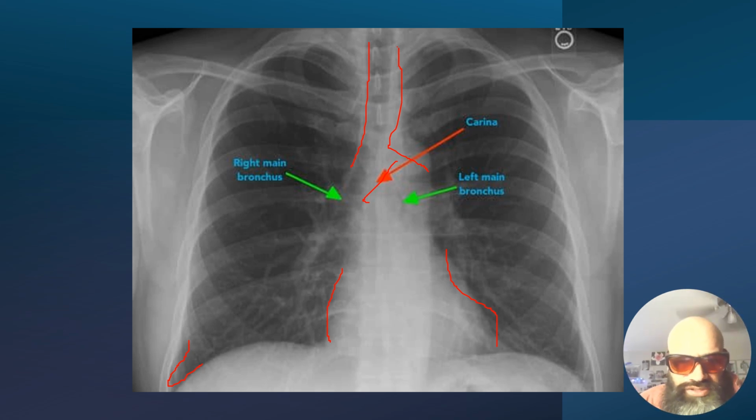But yeah, this is what you should initially start doing when you get the chest x-ray. Start locating the trachea, the carina, left and right mainstem bronchi, the hilar vasculature, cardiac borders, making sure you can see certain densities. And if you understand normal, you'll most definitely be able to understand abnormal.